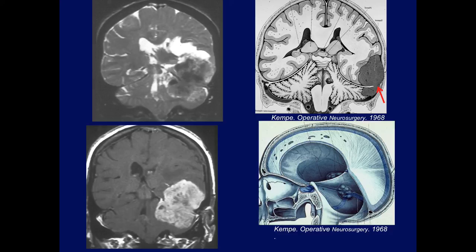Now sometimes these meningiomas, which are laterally involving the sinuses, can get massive. Here's another case that Rick gave me, and notice it's eroded the tentorium here. I'm sure it affected the sinus, occluded it, and here we can see this type of lesion on either side of the tentorium.